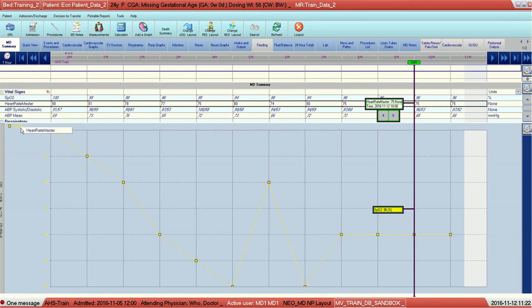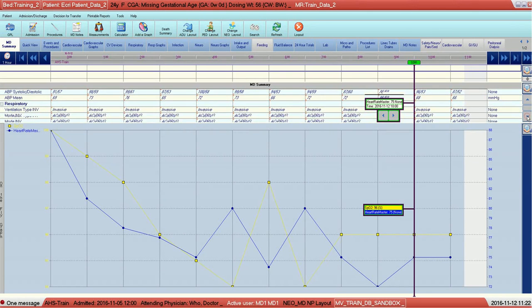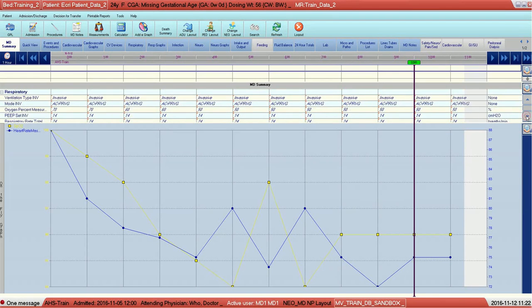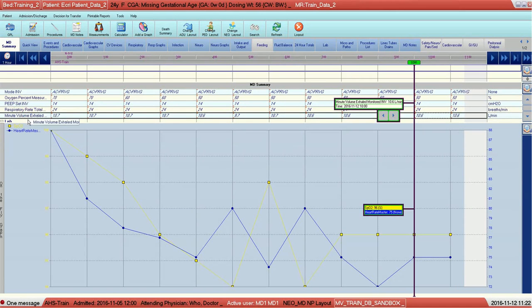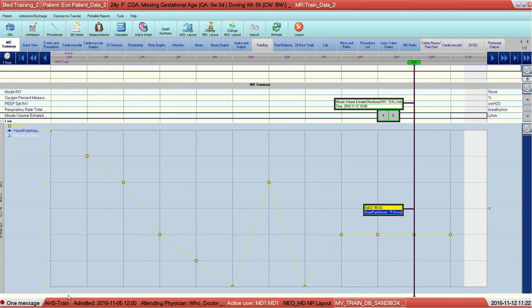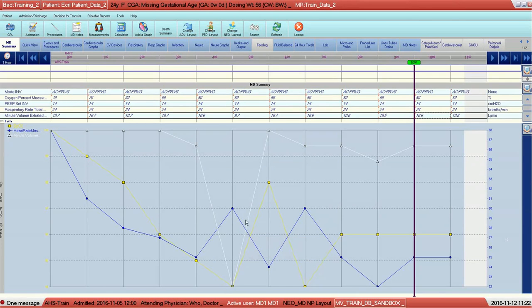You can see that it's coming down, and let it go. And we move that minute ventilation over. Let's take a look at that and graph that. And click and drag it down. And there you go. And so now you have a graph of 3 variables against each other over time.